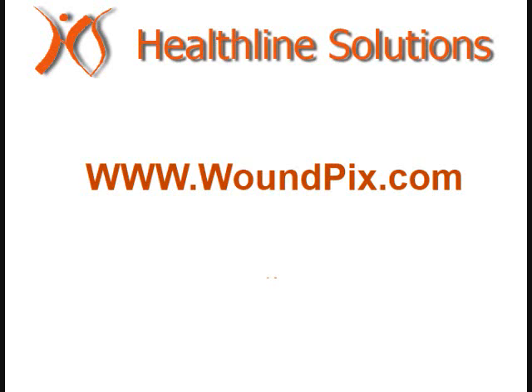That's a quick tour of HealthE Pics. Remember that it's not just for wound care. If you've got pictures you need organized and viewable from your hospital or practice management system, this application can help.